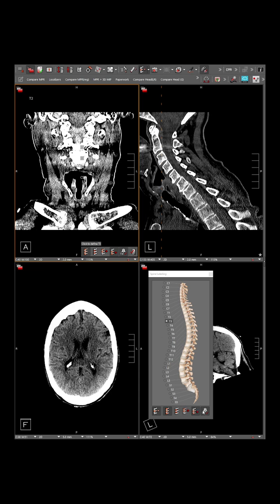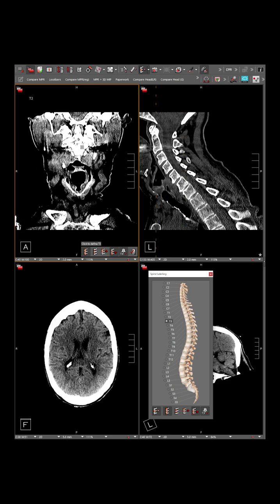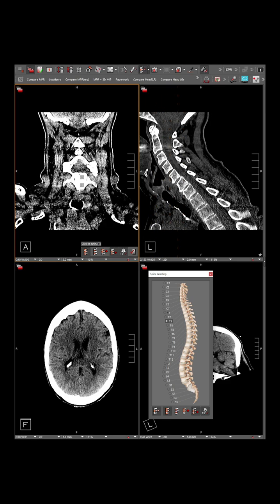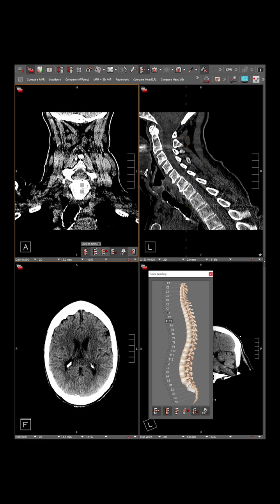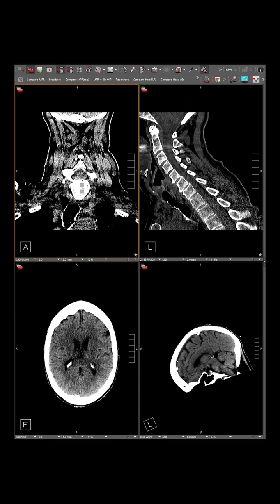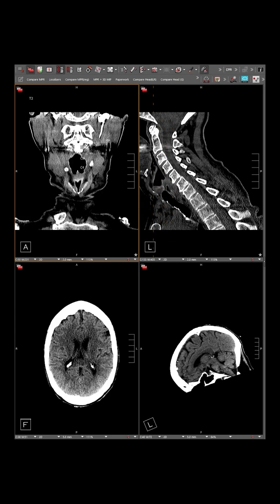So if you don't have that clicked, it's not going to show on this set of images. We want to have that so that all the different images will have the coordinates of each annotation ported to each different image set. That's pretty helpful. And then I press OK, and that goes away, and then I can go back to my window and level tool.